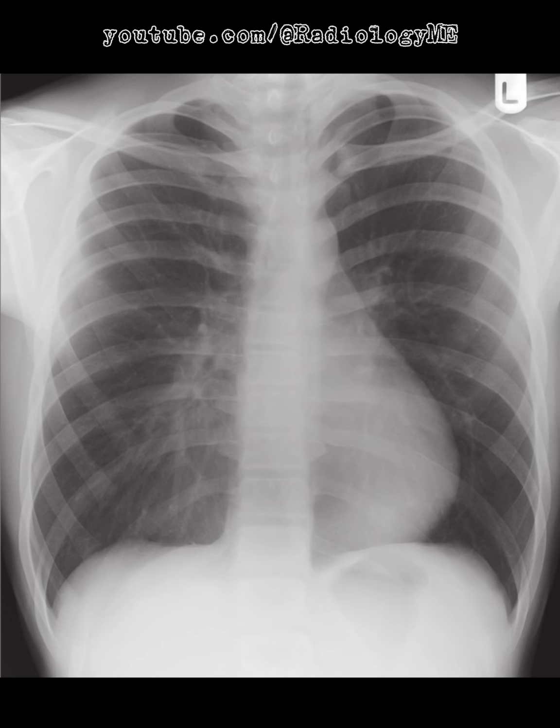Now, a question that could come up here is how to distinguish pectus excavatum from a middle lobe consolidation. And the key here is really in the morphology of the ribs. Horizontal posterior ribs with sharp inferior angulation are hallmarks of pectus excavatum, whereas consolidation would present with parenchymal changes like air bronchograms or a more homogeneous opacification in the affected area, neither of which is present here.